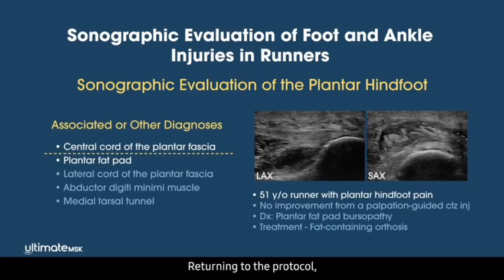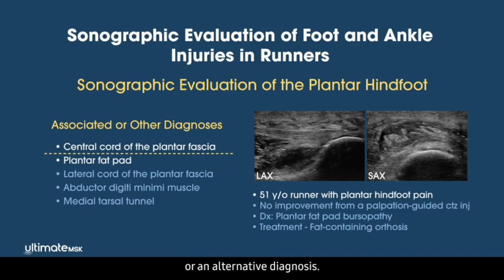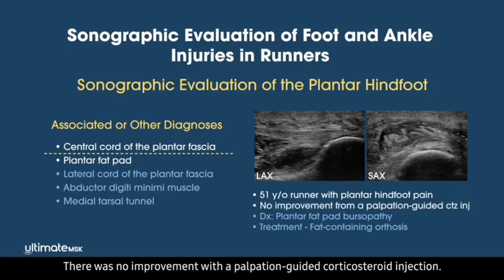Returning to the protocol, it's important to assess for coexisting diagnoses with plantar fasciopathy or an alternative diagnosis. This next case involves a 51-year-old runner with plantar hindfoot pain clinically diagnosed with plantar fasciopathy. There was no improvement with a palpation-guided corticosteroid injection.